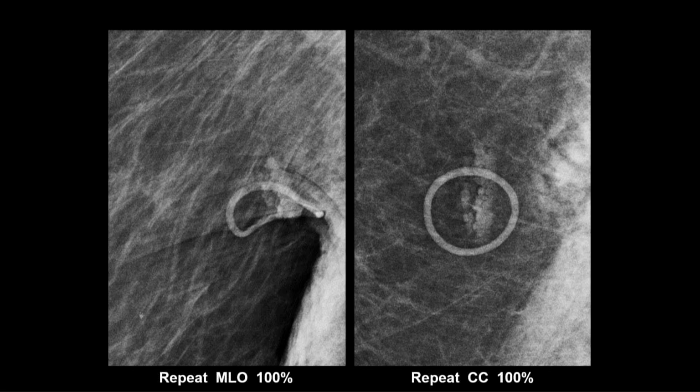And when we recalled her, the first recommendation we made is lift up the breast and put a skin marker on anything you see before you start taking other pictures. And these are the only 2 pictures they got during the workup. That dovetails into my next thought. I get the impression you guys don't do tomo on your routine screen. Yeah, it probably would have, yes.